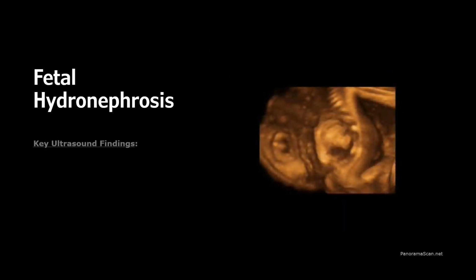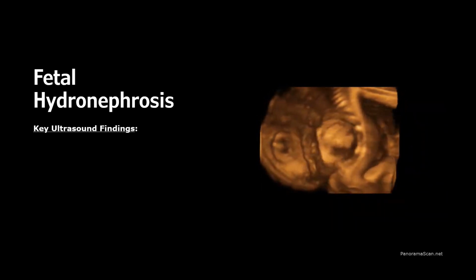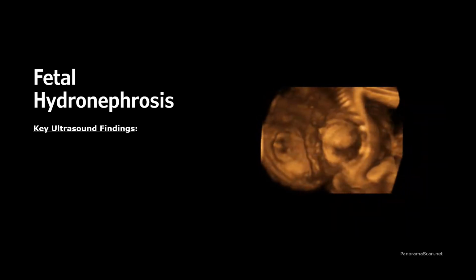Let's take a look at some additional findings that can help us evaluate the severity of fetal hydronephrosis. In more severe cases of hydronephrosis, we may observe cortical thinning.